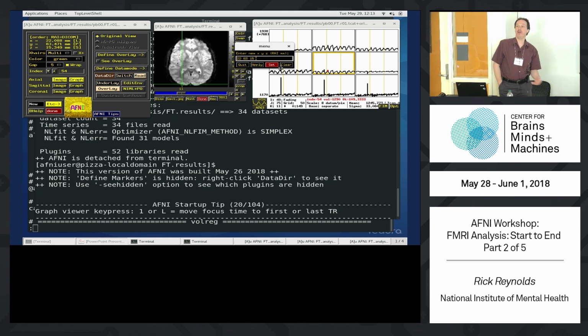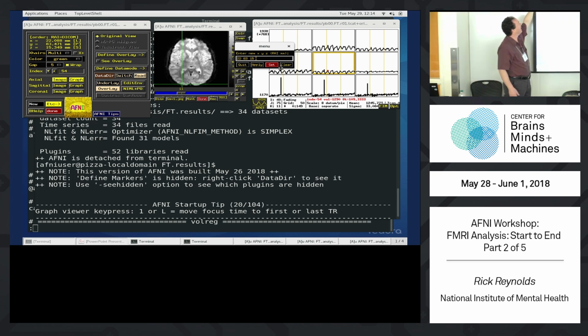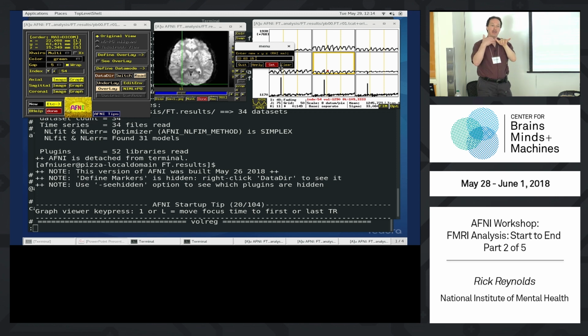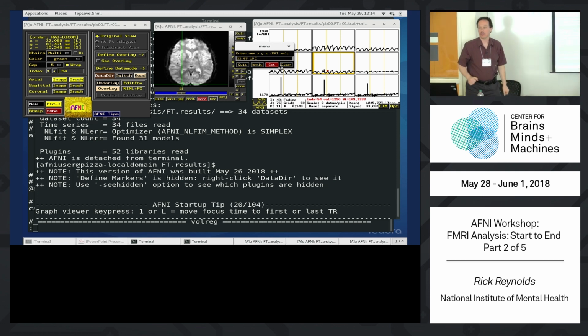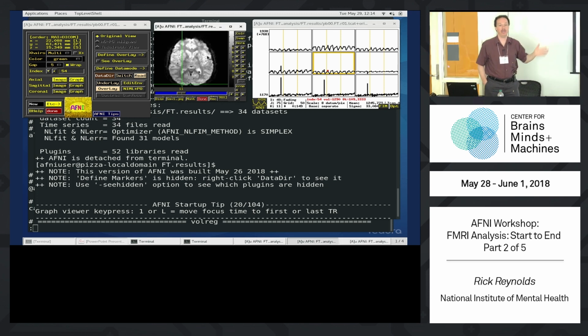These voxels are about 3 millimeters on a side, so you don't have to be exact here. As long as you're approximately in the ballpark, that's why I just used integers. We could type in the actual decimal places, but those are going to land on the same voxel, because I'd have to be almost 1.5 millimeters off to jump to the neighbor. AFNI is going to find the closest voxel center to these coordinates. And now hit set. Lo and behold, nothing happened for me. I was already there, but hopefully we're all looking at the same thing. Any questions getting to this point?